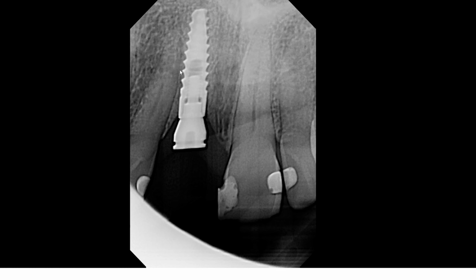If you have never heard of it, it's SLOB, which stands for same lingual, opposite buccal. We just shifted the tube toward tooth number 9, which means if this implant were more lingually positioned, it would follow in the direction of the tube.